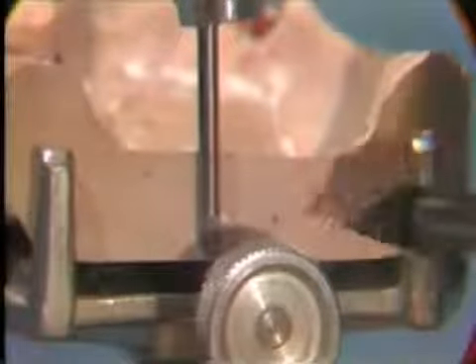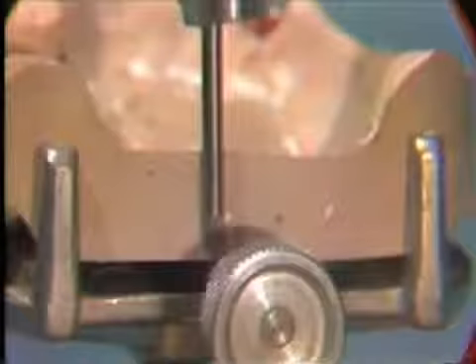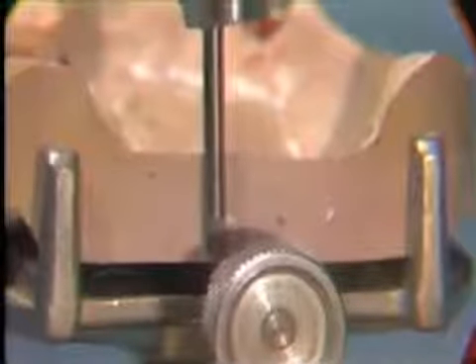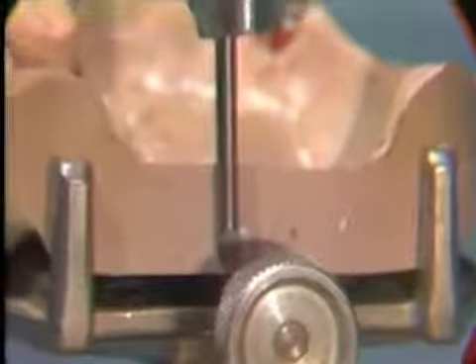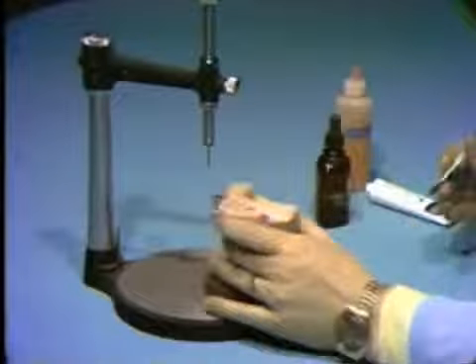This position may be preserved by marking the sides of the cast with orientation grooves, by placing the analyzing rod against the posterior and sides of the cast while you cut a groove in the cast with a sharp instrument. Another method is to use a permanently secured metal rod in the base of the cast.